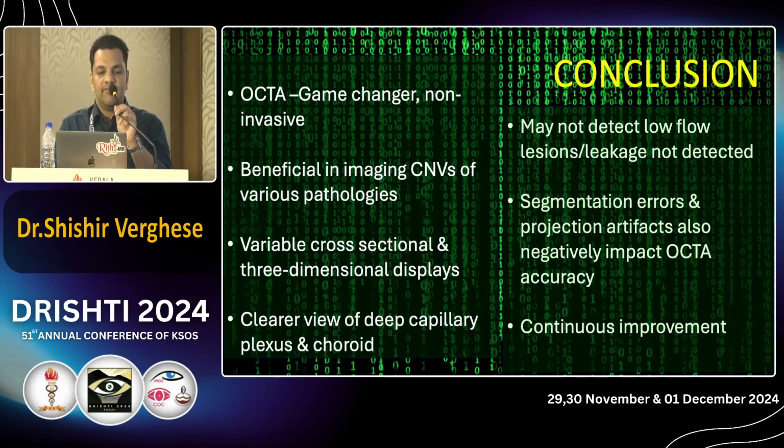So OCTA is definitely a game changer as it's non-invasive, it's beneficial in imaging CNVs of various pathologies, and it gives you a clearer view of the deep capillary plexus and the choroid. It may not detect low flow lesions, and segmentation errors and projection artifacts also negatively impact the OCTA accuracy, but continuous improvement and updating of the software definitely helps in identifying and treating the pathology better. Thank you.